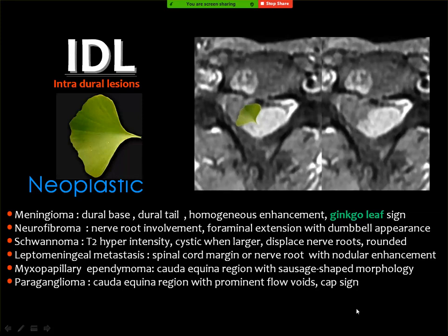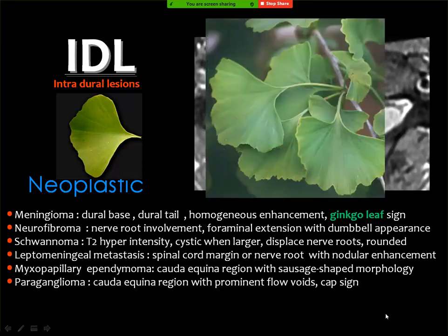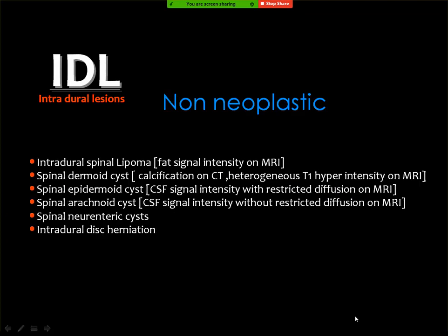I don't know if I pronounce this right or not. And this is the correlated image. This may be seen in some cases and help you to spot the diagnosis of meningioma.